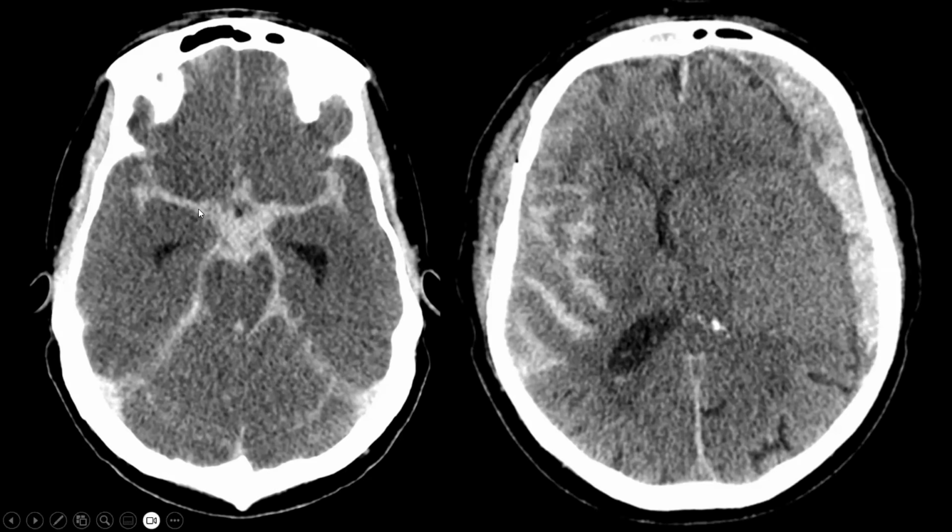An aneurysmal subarachnoid hemorrhage will mainly have subarachnoid blood located in the basal cisterns and less along the cerebral hemispheres. This is a typical pattern as can be seen in a ruptured cerebral aneurysm. In a traumatic subarachnoid hemorrhage, the blood can basically be located anywhere, but the predominance of blood in the basal cisterns will often not be present.